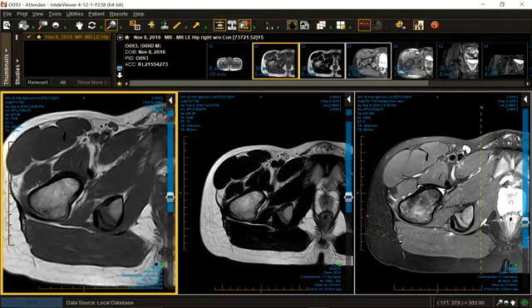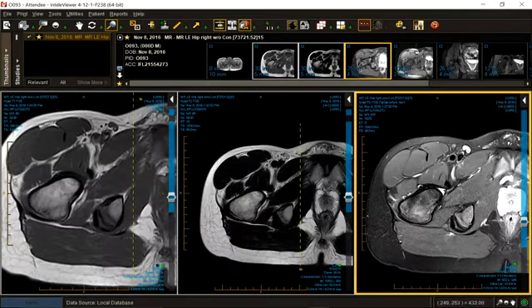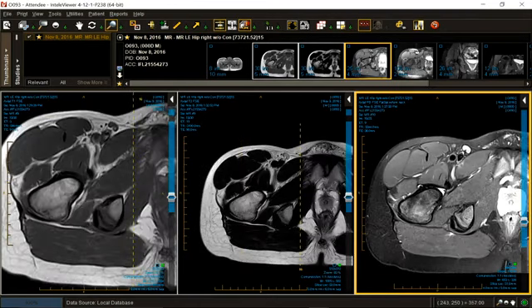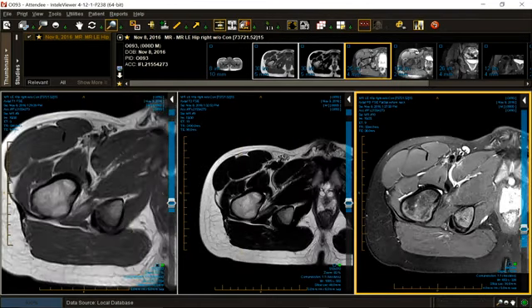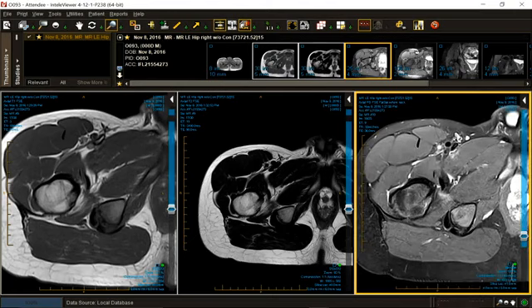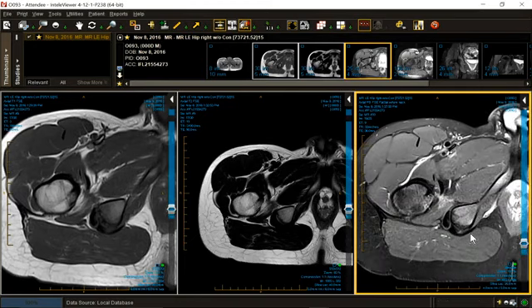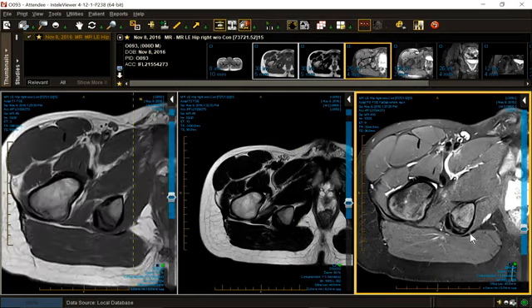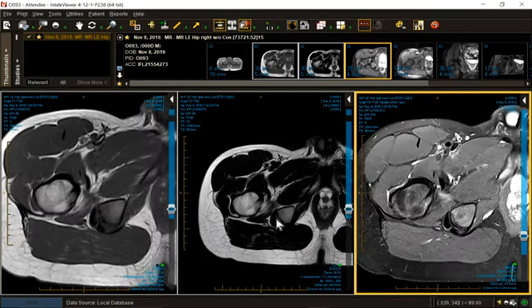Give a beautiful look at the hamstring anatomy. The ischial tuberosity is an important way station for innumerable structures, like the adductor magnus and the sacrotuberous ligament. But it is also the takeoff zone for the hamstrings. Now, the hamstring anatomy is a little bit counterintuitive.